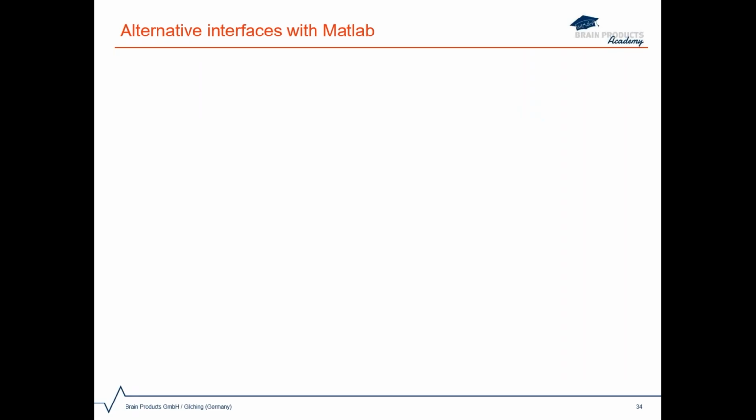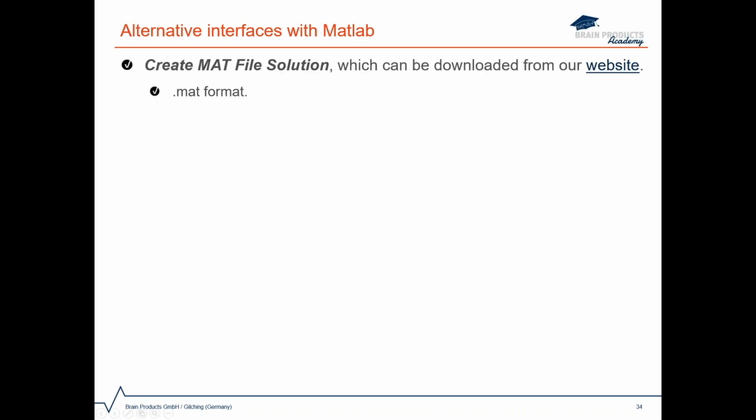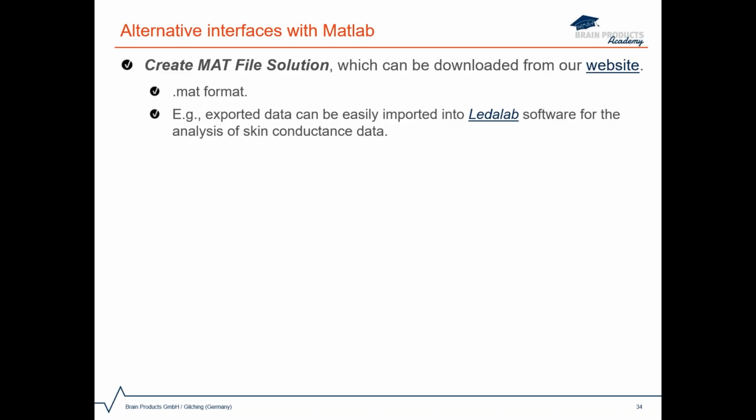Under certain circumstances, you might want to export the data from Analyzer and proceed further in Matlab-based toolboxes. For this, we offer a solution called Create Mat File that allows you to export data in .mat format. It is part of our Analyzer Solutions package, which can be downloaded from our website. For example, this exported .mat file can be imported directly into the LEDALAB software, which is a Matlab-based software for the analysis of skin conductance data. In Matlab, you can import the data using the load function.